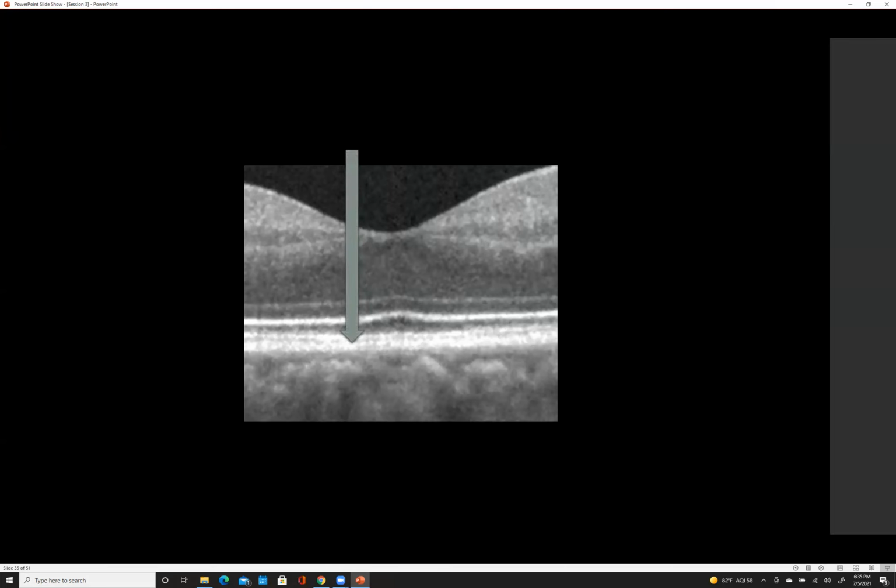And then what is that layer? What do we call it? We're calling it the RPE/Bruch's complex. Correct. And why is it bright? It has very tight junctions because it's the blood retina barrier. Exactly, so there are tight junctions. That is a pathologic designation, or I suppose an electron micrographic designation. There are tight junctions between the RPE cells. So that's legitimate, you could point to it, and there's a protein that connects them. The same thing up at the Mueller cells on the ELM, between the Mueller cells and the photoreceptors.